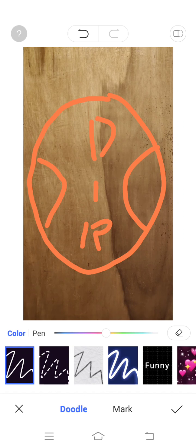Okay, this area here on top for the distance. This is what you use if you're, for example, watching a movie, okay, or watching TV. Okay, so this is what you will use, this area here. When you're using your computer, especially the desktop computer, you're using the intermediate, the one with the eye. Okay, here. This one is the intermediate area.